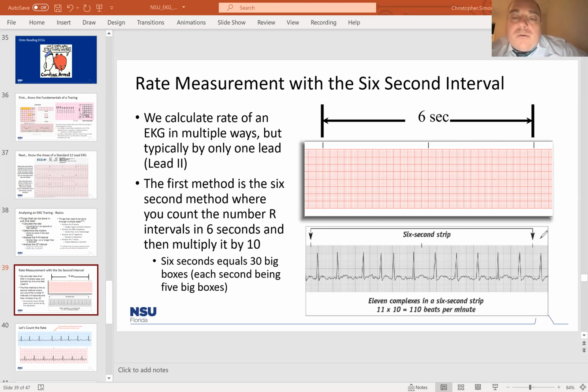And you're like, well, what is going on here? Well, the patient's heart rate is not bouncing around in 200 point interval swings. That's not what's happening. The computer is basically calculating the rate from one R to the next. And every time that R changes in width between this one to that one to that one, it's a totally new rate every time. So the computer can't figure out what's going on sometimes.